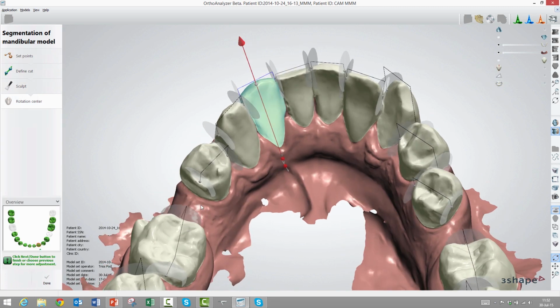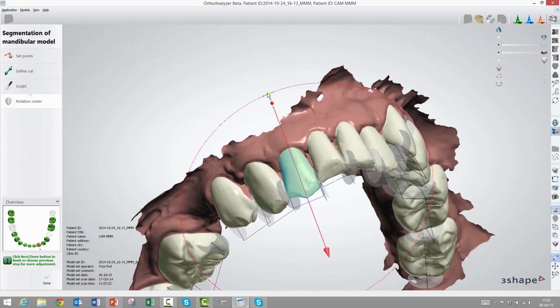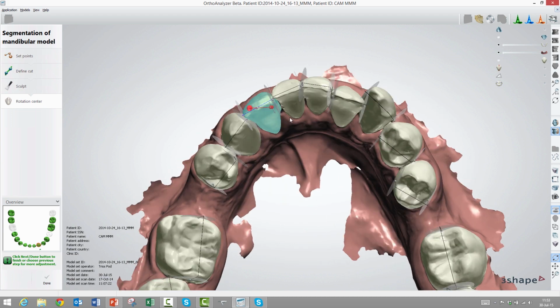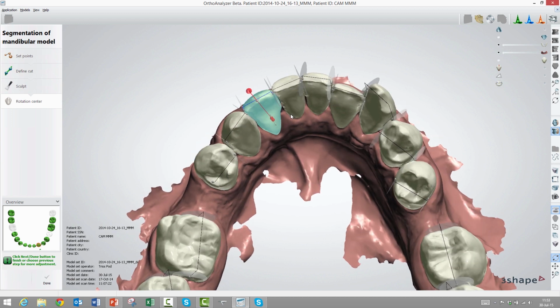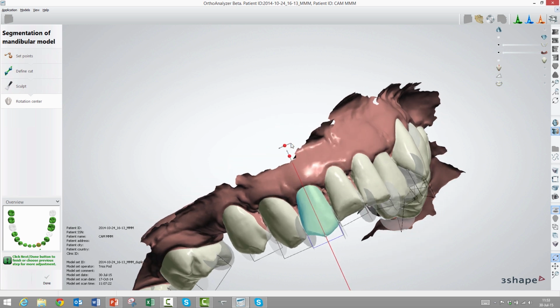And we're already in the rotation center here. And in this part, we'll go in and make some directions, setting the tooth axis in the right direction. Yeah, and I guess this view is where if you had a CBCT overlay, that would help you adjust the long axis. Exactly. And exactly this point up here is the rotation center of the tooth. So you go in and set it exactly where you want the rotation center. Very, very important.